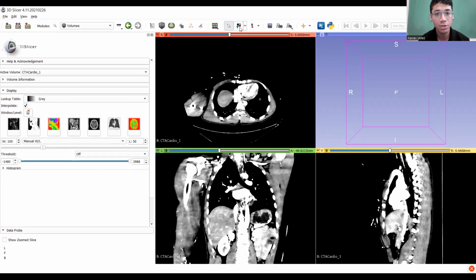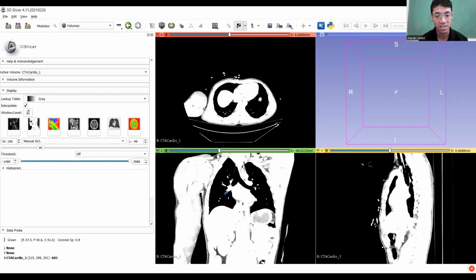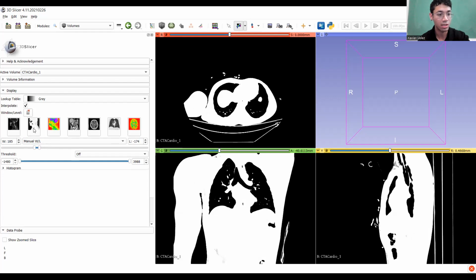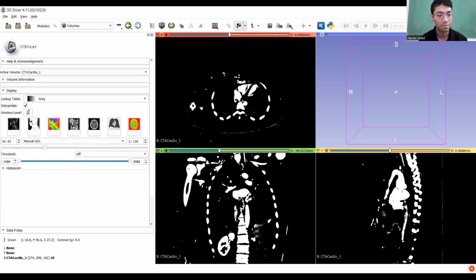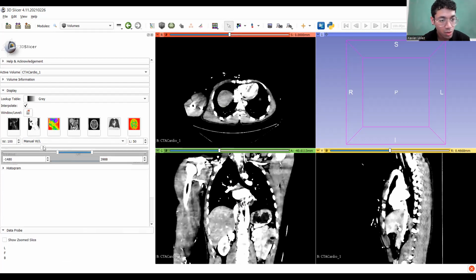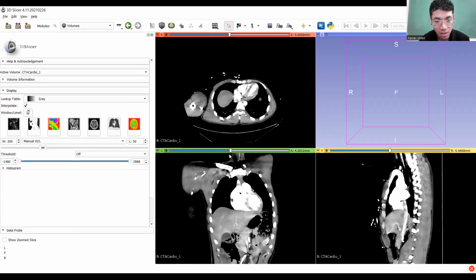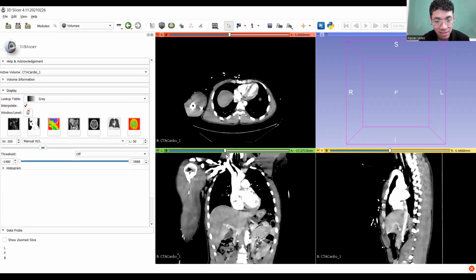Another tool up here is to manually increase or decrease the brightness. So if I click this instead of my mouse here, I'm in this little tool, and then I click and scroll up or down, I can increase or decrease the contrast that way. And you can see on the left-hand side this shift over here. So again, just different tools you can use. I don't want to spend too much time on this, but okay. So I'm going to go to this one and make it, I think that's at least a little better in my opinion. So I'm going to use that.